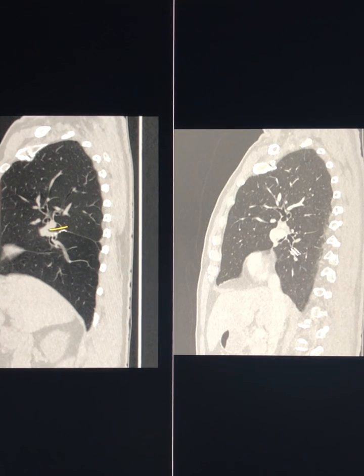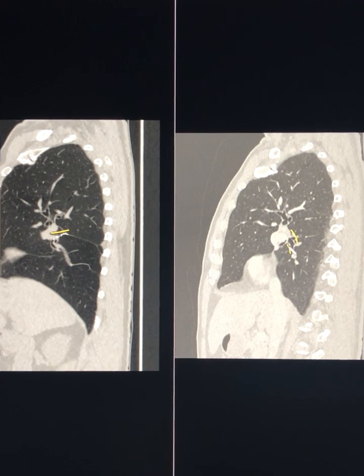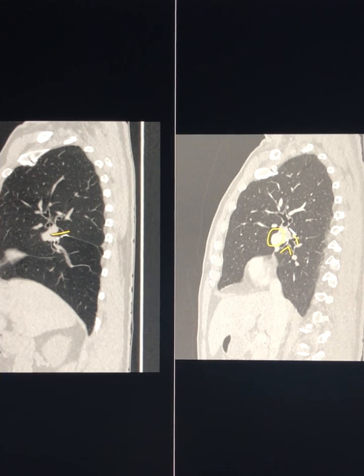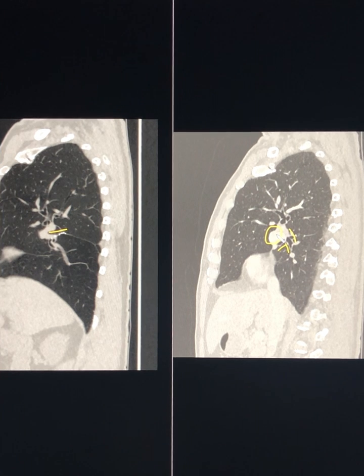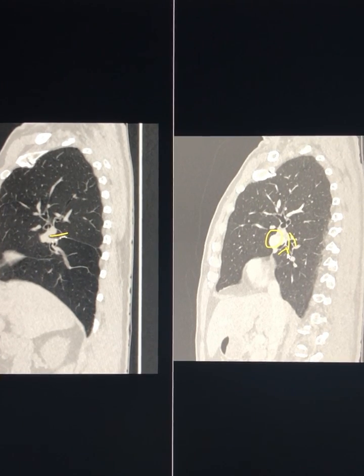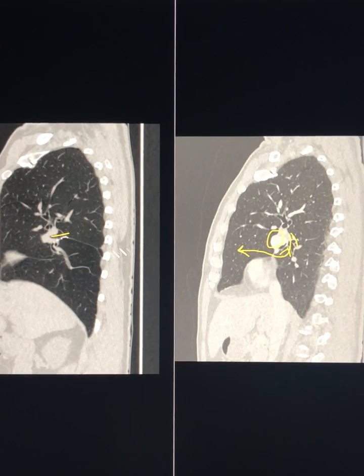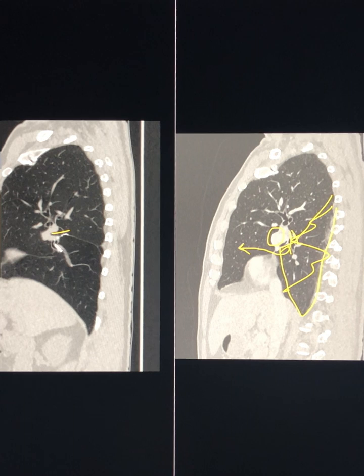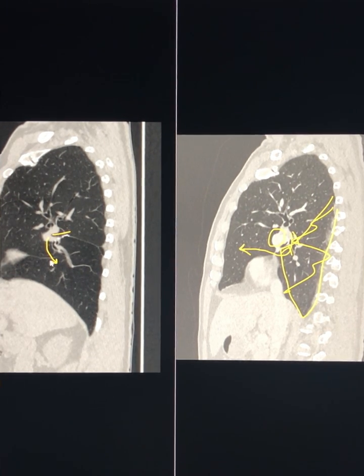At first, we're going to evaluate the hilar region, where you can see that the bronchus to the right lower lobe and the middle lobe traverse posterior to the pulmonary vessels, and the middle lobe pulmonary artery extends in front, and the middle lobe bronchus curves around and extends anteriorly. When the right lower lobe is removed, the bronchus no longer has that curve, and you can see that it in fact curves posteriorly in that manner.